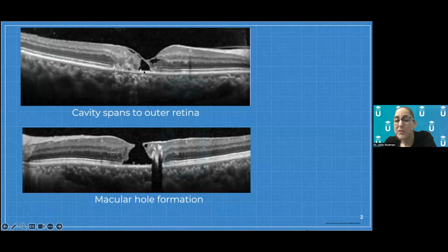You're going to get almost what looks like a macular hole formation. You have fusing of this superficial cystic space and the lower cystic space that happened at the photoreceptor integrity line. Now the RPE is not working because we're losing that connection with the blood retinal barrier. And that's why you see these hyperreflective spots, which is RPE hyperplasia or pigment plaquing. So it all makes sense if you think about it from the pathophysiology standpoint instead of memorizing it.